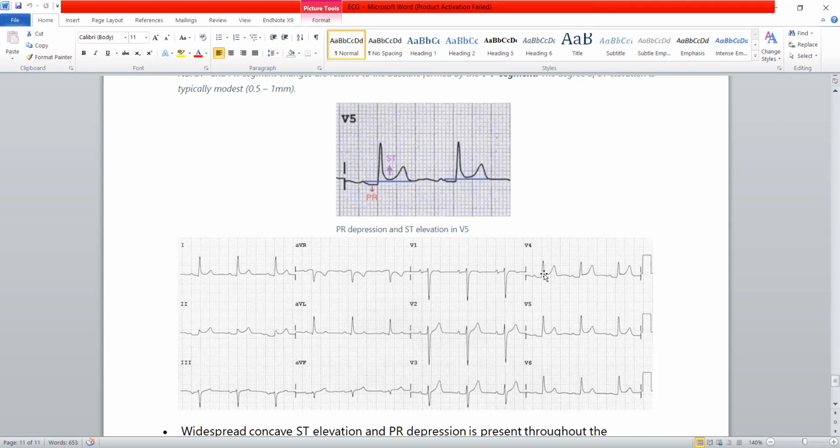Which spike are you talking about? The spike is the R wave. The spike is not a Q wave. Remember that the Q wave is a negative wave. So the upward spike cannot be a Q wave. The first negative wave on the ECG is the Q wave, and the first positive wave is the R wave. The second negative wave is the S wave. So Q and S are negative waves, and R is a positive wave.